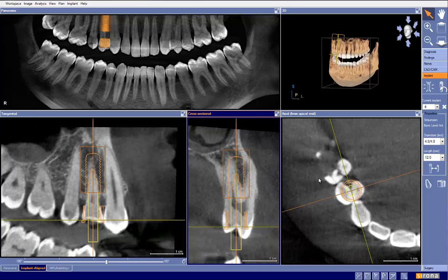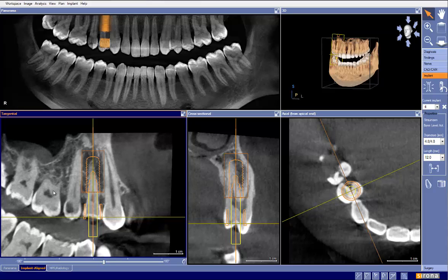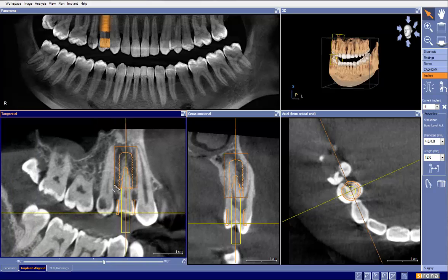support of this. Now the last thing we want to take a look at is our occlusal plane. And what we can see here in looking at this, is we have a line kind of like so. And in an ideal world, we would like this line to be more straight across, giving support to that tooth. So this would require some tilting and moving, probably more along the lines of something like this.